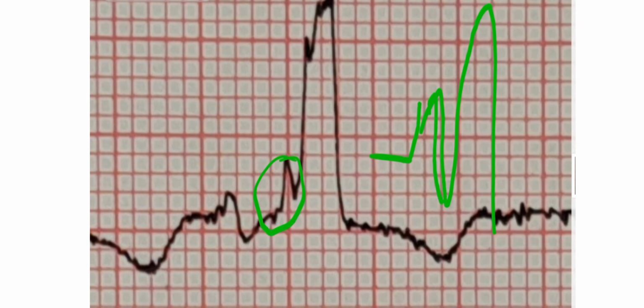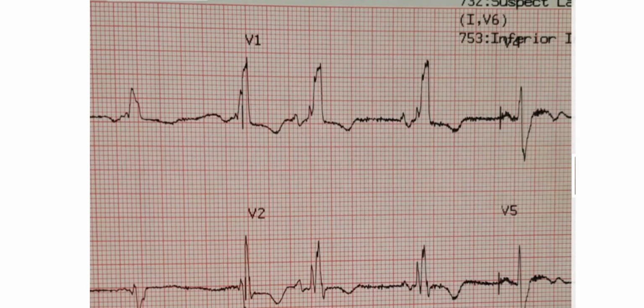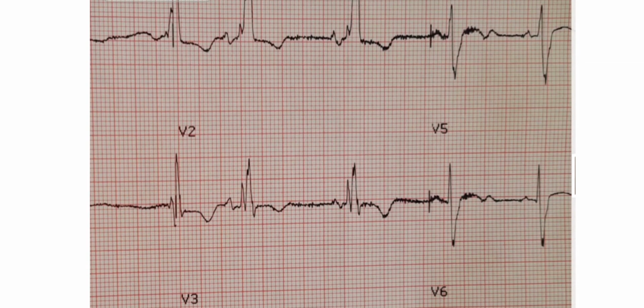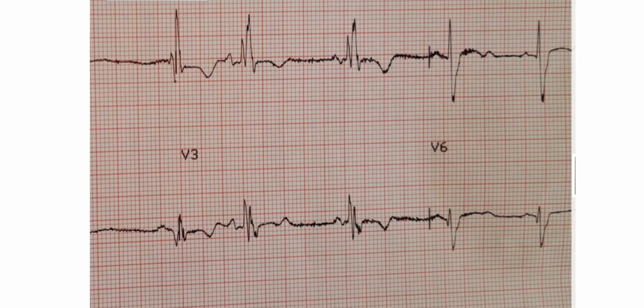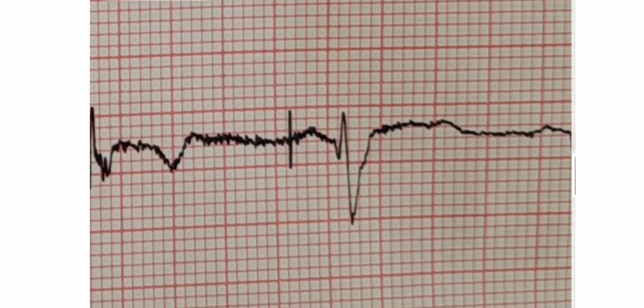This is different from a W-shaped morphology, which we're going to see now in V6. Let's go to V6. Here is V6. Let's zoom in.